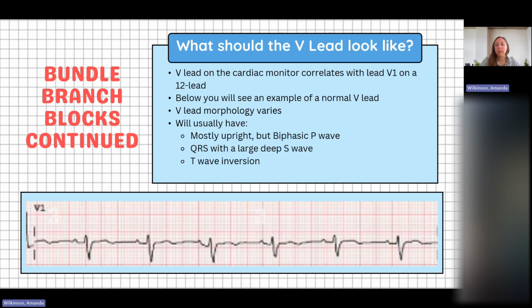When you're using the V lead on a bedside monitor, you're usually looking at lead V1 from the standard 12 lead ECG. So that's what we'll use as our reference point. Here's an example of a normal V lead morphology.